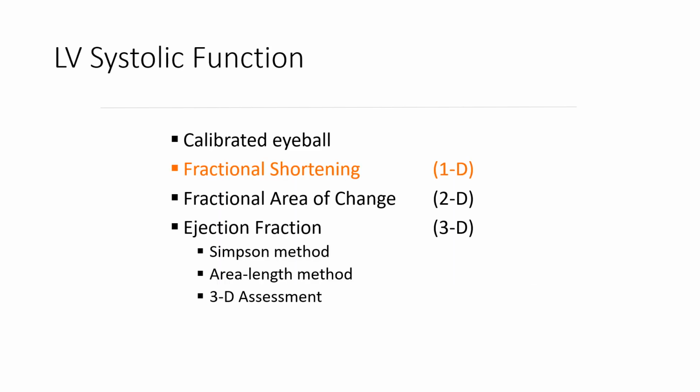So really, using one of these quantitative methods that we're going to talk about next and correlating that with what you're visually estimating is the best way of calibrating your eyeball.